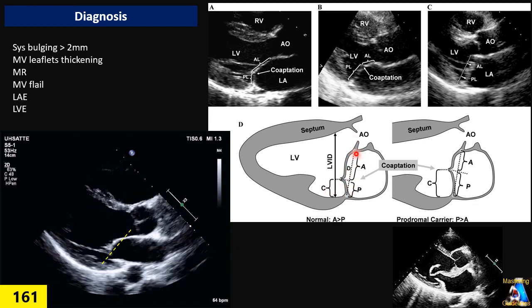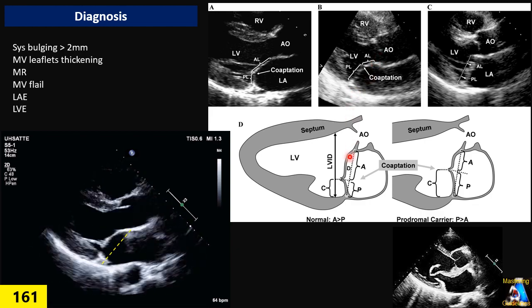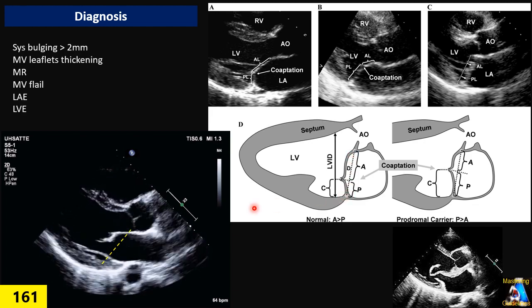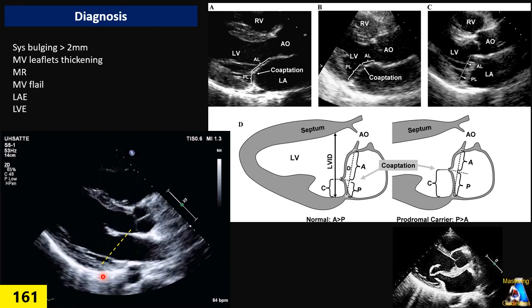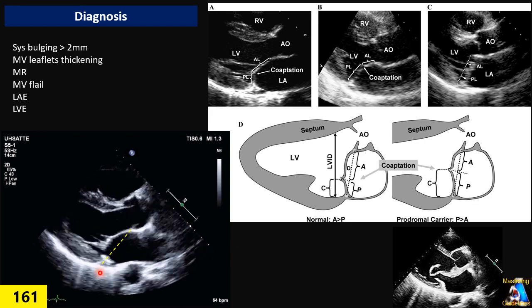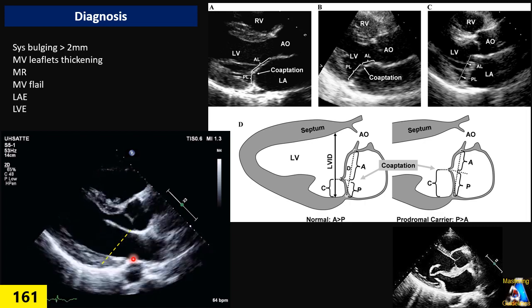At the anterior, you can see the insertion of the aortic valve, and next to that is the hinge, anterior hinge, and posterior. With the cine loop going back and forth, you can see exactly which spot the posterior mitral valve leaflet connects to the atrioventricular junction or annulus.